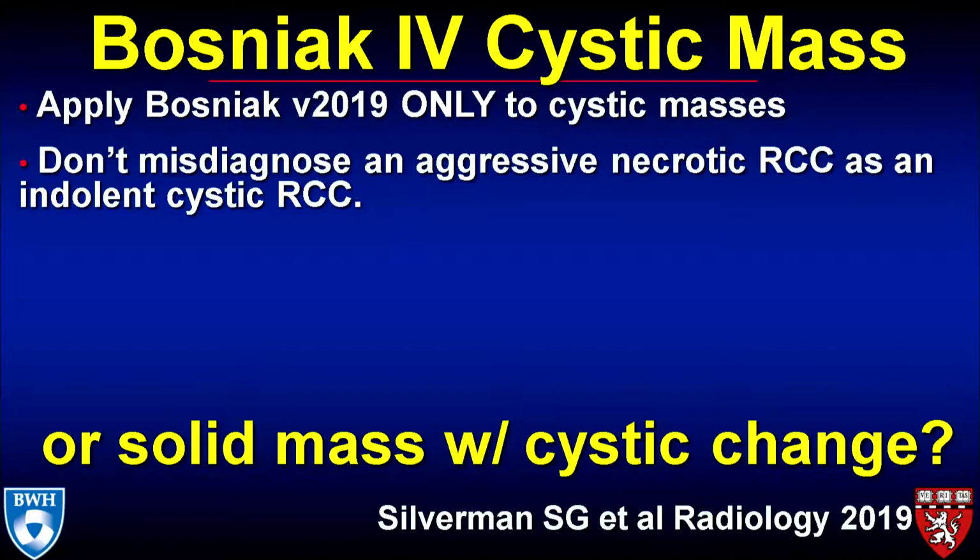Don't misdiagnose an aggressive necrotic RCC as an indolent cystic renal cell carcinoma. We spent a lot of time distinguishing necrosis from cyst. There's really no good definition, but try your best. Cysts are generally thin-walled, well-defined areas where necrosis is more ill-defined and more central.